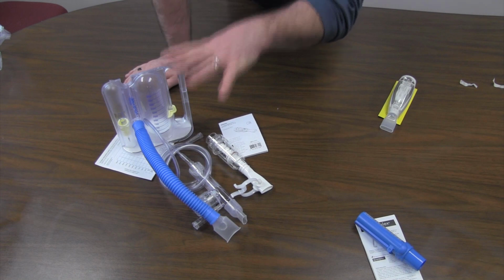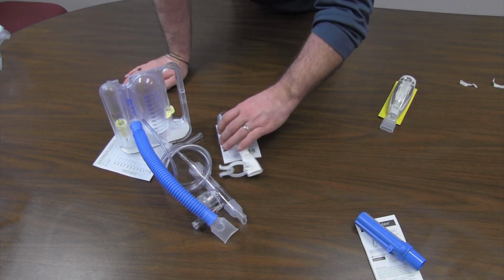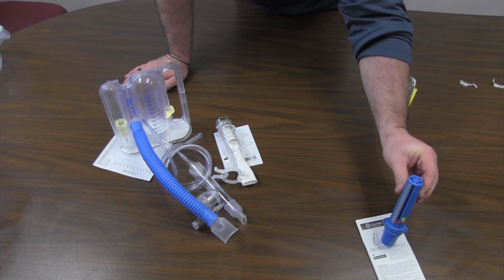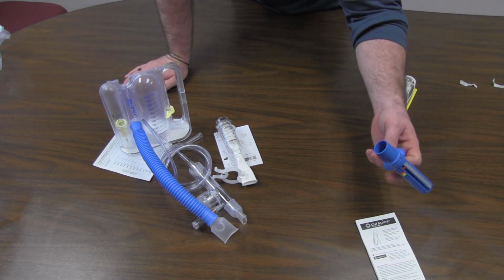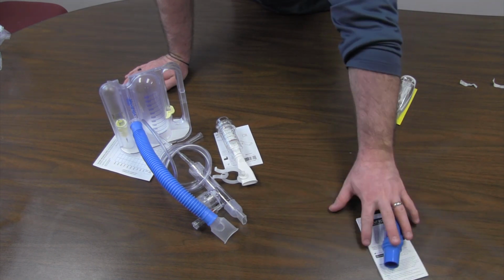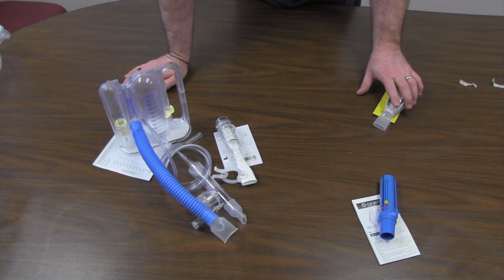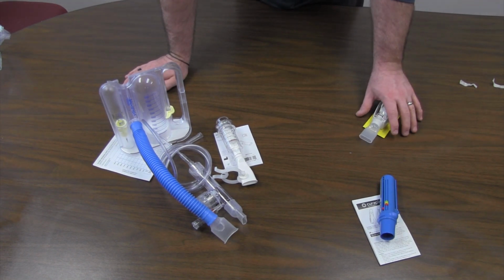So we have recruitment of alveoli here with our IS, our EasyPAP, and our threshold PEP or inspiratory muscle trainer. We also have over here a simple monitoring tool, the peak flow meter, with no therapeutic value at all, except that it's a good monitoring tool for your asthma. So don't get those mixed up. This is something totally different. And then your Acapella is to move secretions. You can also recruit alveoli by moving secretions, but it is mainly for moving secretions.